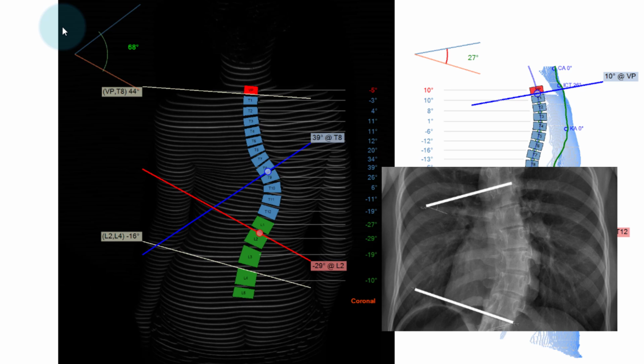So, how can a clinical application be made? At the beginning of a scoliosis diagnosis, there is an obligation to perform imaging diagnostics by X-ray. By taking a photometric image directly afterwards, an individual correlation value can be determined that quantifies the difference between the two angles. Based on this, the scoliosis angle can be used first in follow-up examinations. When there is an indication of structural changes, the X-ray may be checked and then, if necessary, the correlation factor revised.